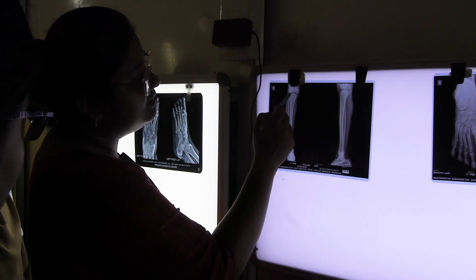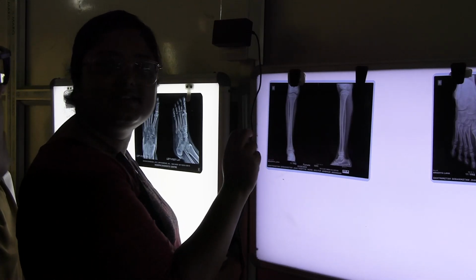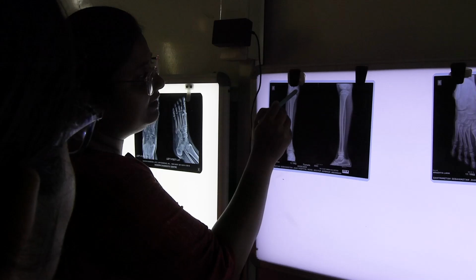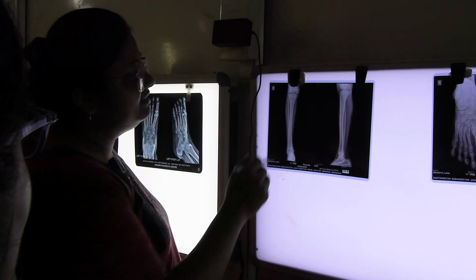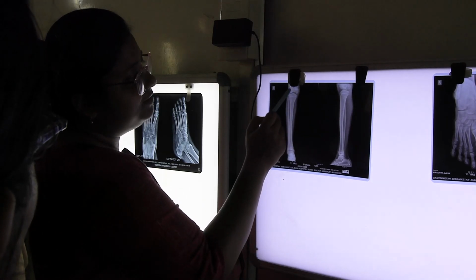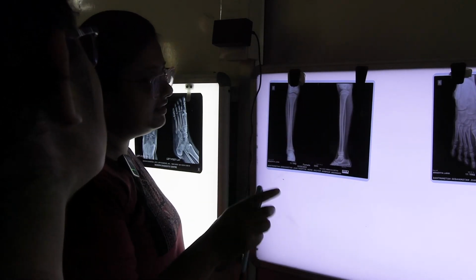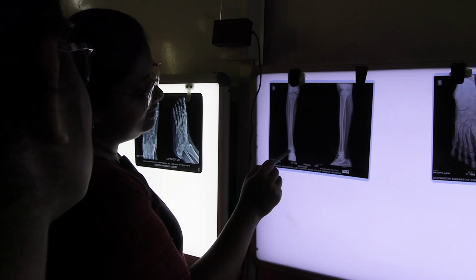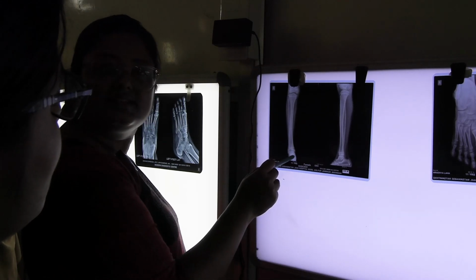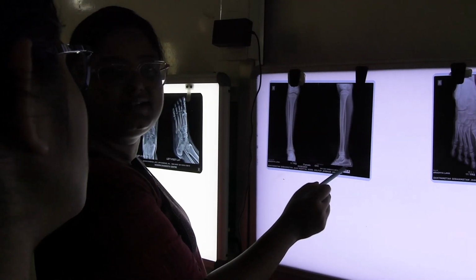And this is the knee joint. Here you can see the epiphysis at the lower end of the femur is also not fusing. The clear epiphyseal line, the black colored line, is the epiphyseal line, and this is the joint cavity in between the femur and the tibia. This is the joint cavity of the knee joint, and here is the ankle joint where it is joining with the talus. So this is the anteroposterior view and this is the lateral view.